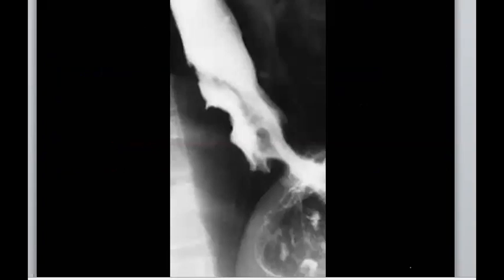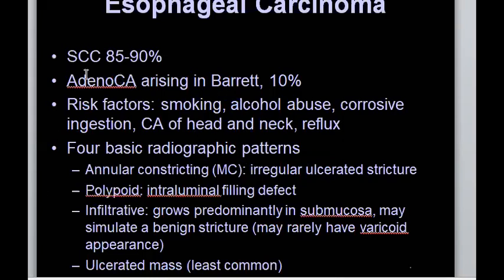What do you think about this? Again, in barium terms, is it a malignant stricture or a benign stricture? I think it is going to be malignant, even with ulceration. Yes, ulceration in the posterior wall. And it is going with something called the Carman meniscus sign. So they mentioned that it is going with esophageal carcinoma.